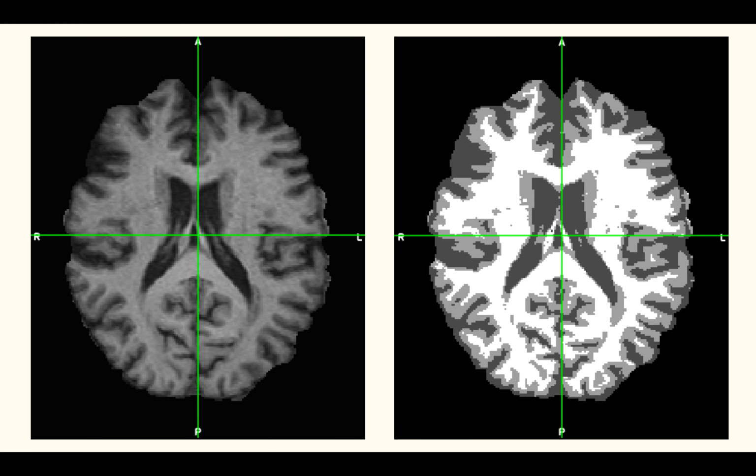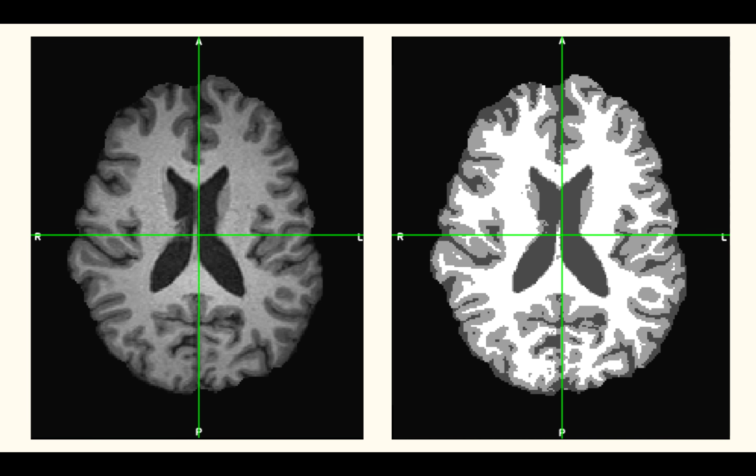Let's look at one of the slices of the 3D sMRI volume, and on the right side we have its corresponding target with 4 classes. Each pixel on the right side belongs to one of the classes: white matter, gray matter, CSF, and the background. This is another of the slices of the sMRI volume.